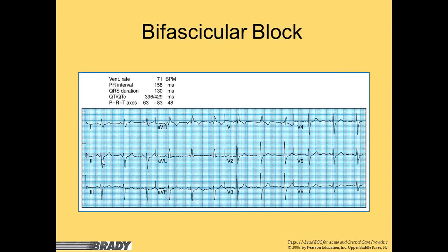And a couple of these others, there's a little notch maybe right in there. Kind of hard to see. There's a notch right in here where it comes up and then switches over. And if this were bigger, you could certainly see it better. But we do have that wide QRS.